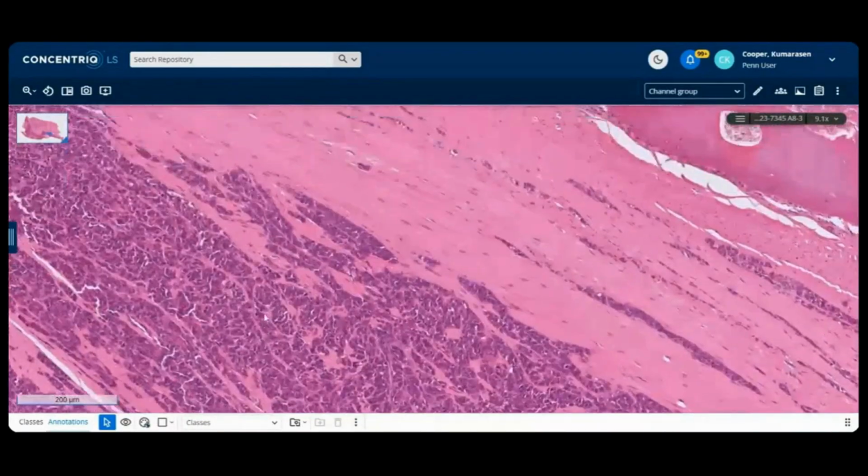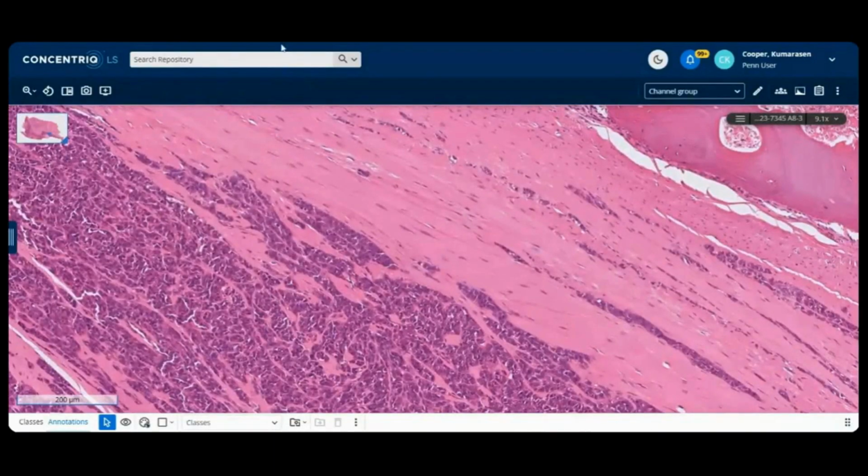Okay, I haven't surveyed your chat box. Let's go back to chat box. Any thoughts? Nothing so far. Cords and nests. A lot of pink cells, epithelioid. Okay, Jan, Ewing-like. I like that, Ewing-like.